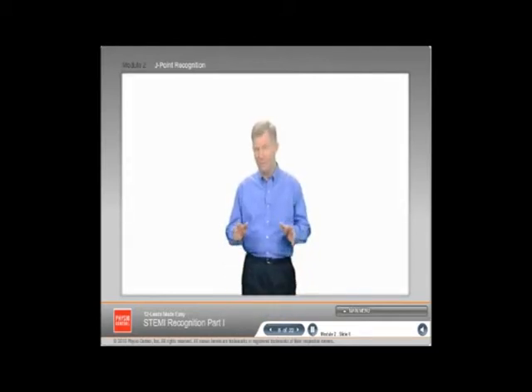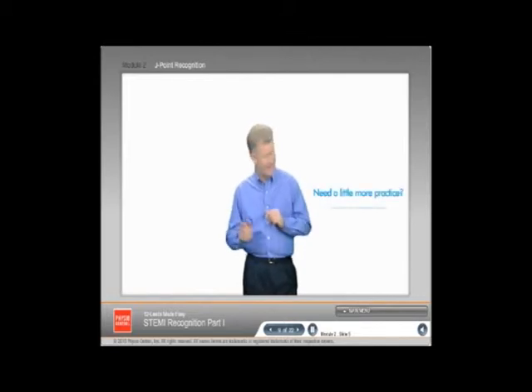Good job. If you want some additional practice finding the J point, click here.